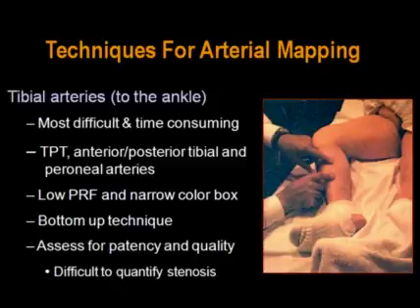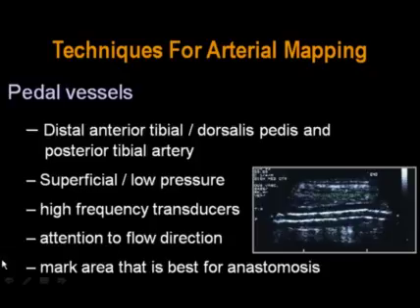It may be difficult to quantify stenosis in these vessels, again, as in patients with multi-level occlusive disease, the drop in pressure from those multiple lesions above that level may make it difficult to elicit a focal area of increased velocity at what may be a hemodynamically significant stenosis.